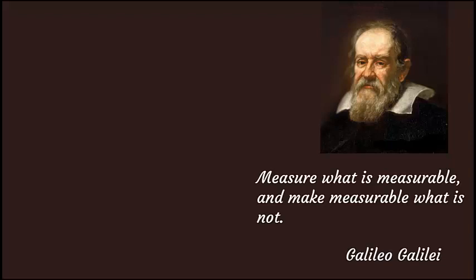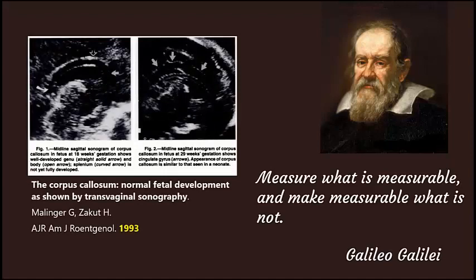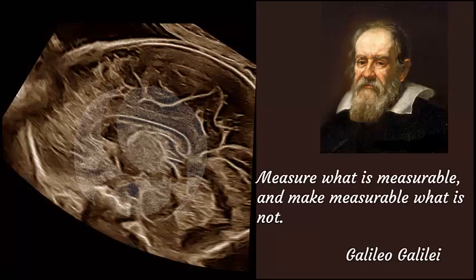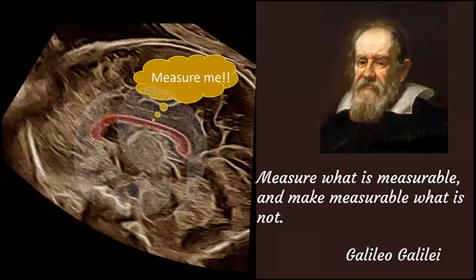Those of you who have gray hair will remember Professor Nicolaides putting a similar slide in many lectures, pushing us to objectify all our findings. These were the best type of images of the corpus callosum that we were able to obtain three decades ago. With such images, the measurement of the corpus callosum was challenging. But with current technology, we can obtain this kind of image that seems to be shouting at us, please measure me.